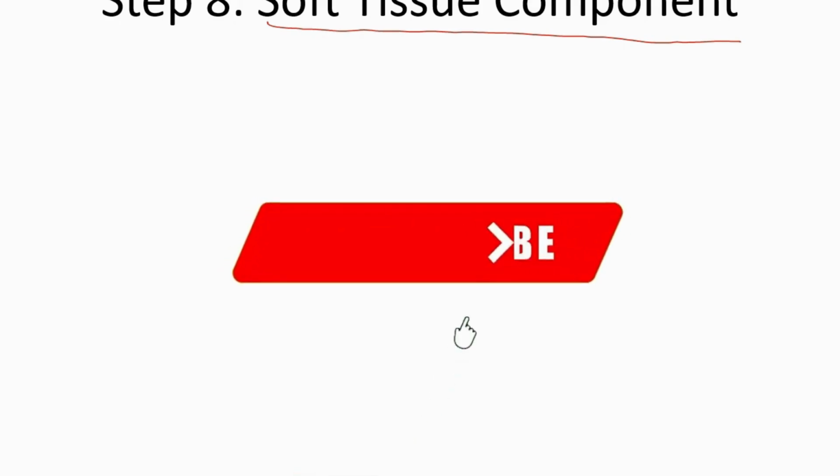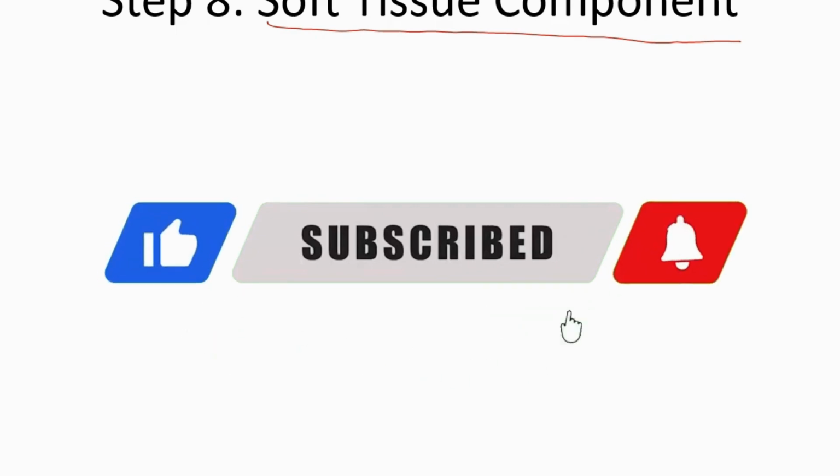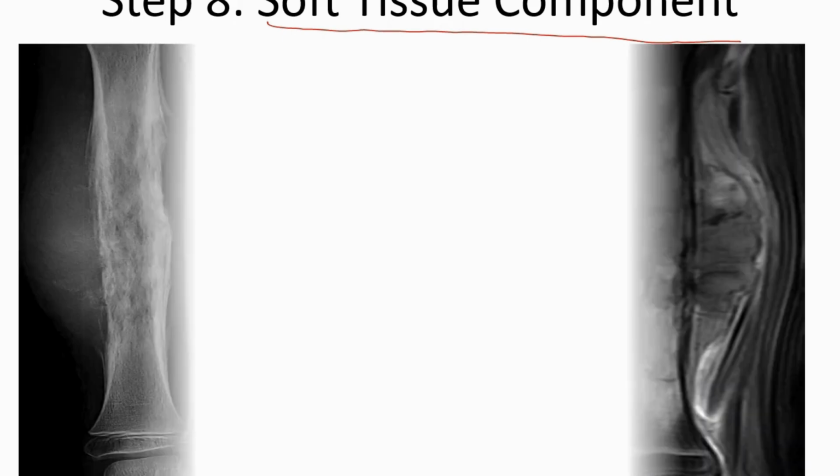Now step 8 is the soft tissue component or soft tissue involvement adjacent to the bone tumor. The soft tissue component is better assessed on MRI and then CT, but it is less accurately visualized on X-ray. A large soft tissue mass with minimal bone destruction is seen in Ewing sarcoma, whereas a calcified soft tissue mass is seen in osteosarcoma.